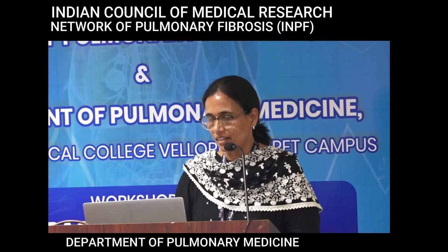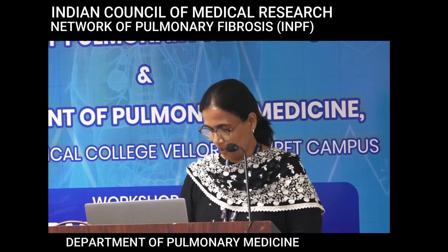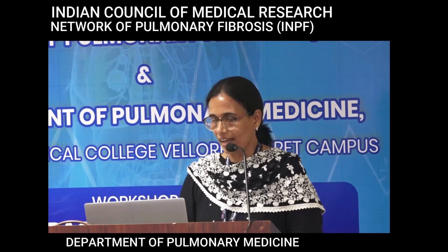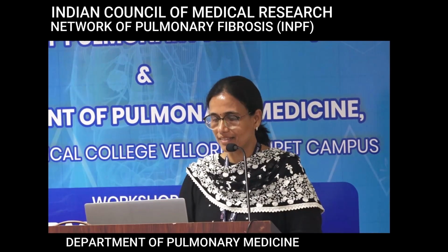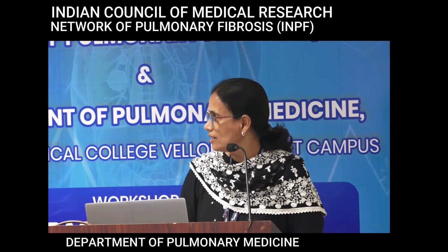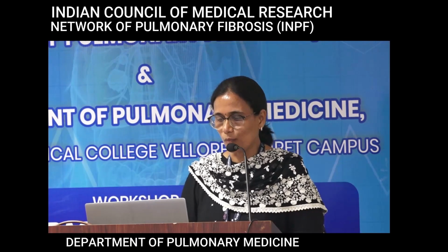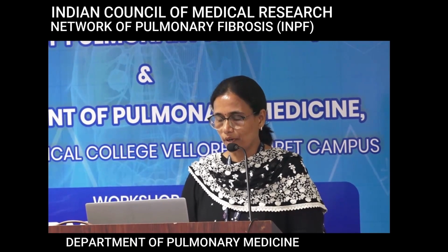So let's start out with the case. Have a look at these images. A 65-year-old with a smoking history and a long history of breathlessness. So what do we see on the images? There is honeycombing with a basal predominance.